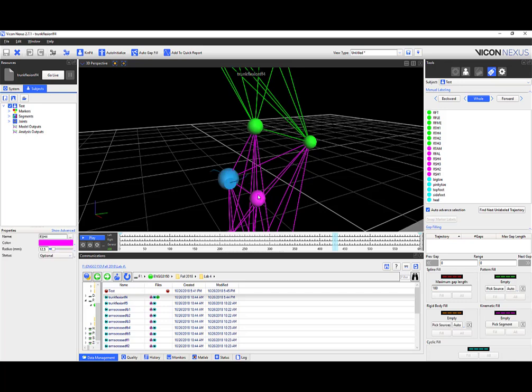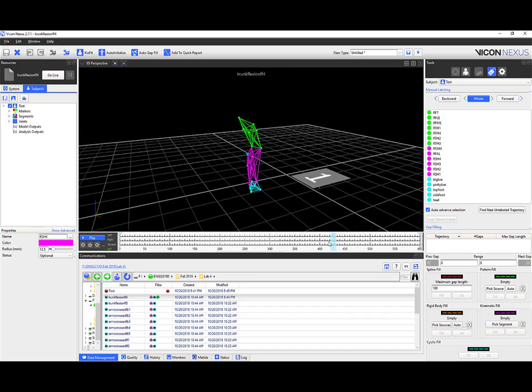Use a donor marker, whether it's this guy, or this guy, to fill in for this guy when he disappears, based on what these guys know of this before and after the frames. So I'll show you what that looks like.